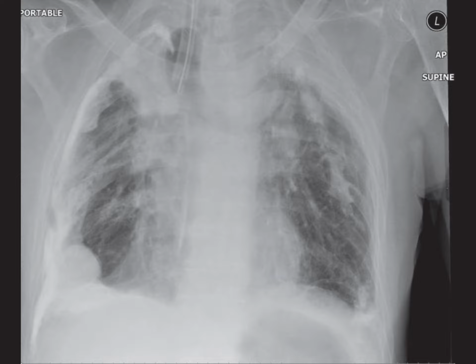Key points on tuberculosis. Tuberculosis, TB, can present in various ways, involving a wide range of pathologies across the body. This radiograph emphasizes the need to be familiar with the spectrum of TB manifestations, both intra- and extrathoracic. Primary TB often shows nonspecific radiographic changes, sometimes presenting as normal in up to 15% of cases. It's crucial to look specifically for a Ghon focus or enlarged lymph nodes, particularly in children or those with HIV.